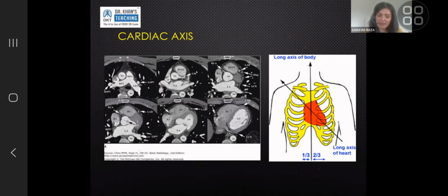In contrast-enhanced scans, especially aortograms or cardiac studies, when you have dense contrast next to it, it again can be missed, especially if the myocardium is quite thin and you're not really looking for it.